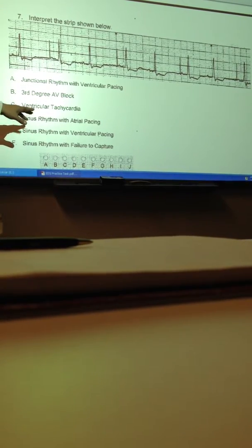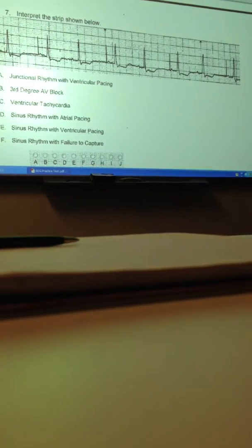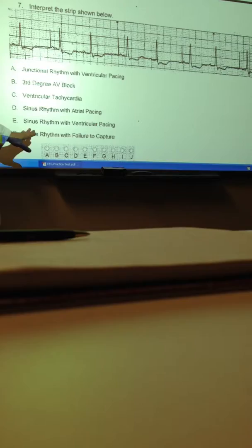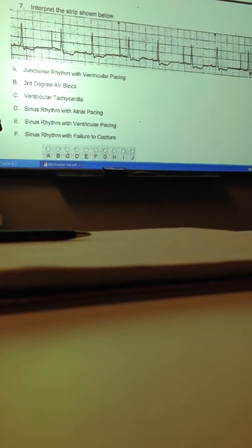Is it sinus rhythm with an atrial pacing? That's what I would put. Is it sinus rhythm with ventricular pacing? No. Well, let's throw that out. Sinus rhythm with failure to capture? No. It's sinus rhythm with atrial pacing.